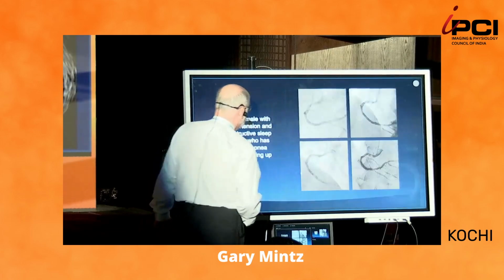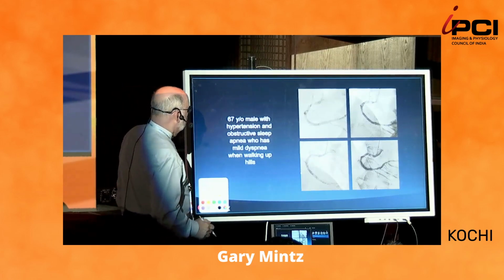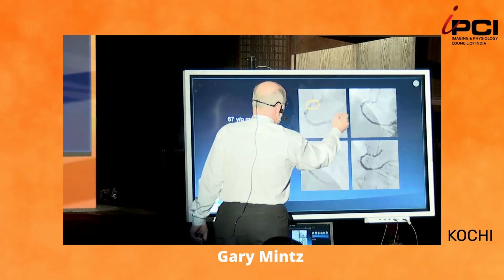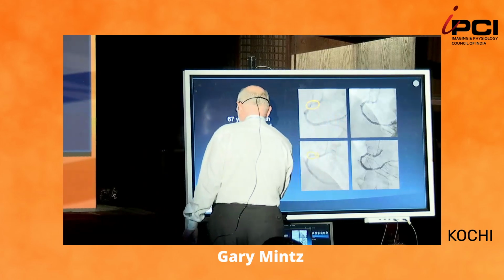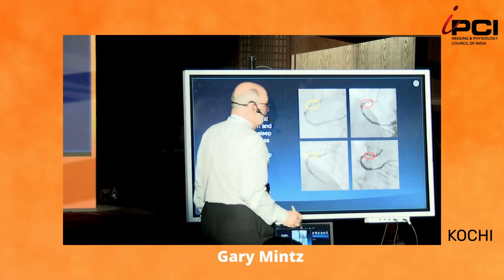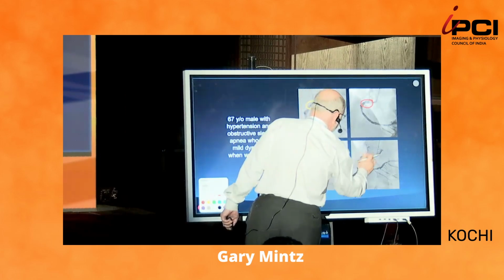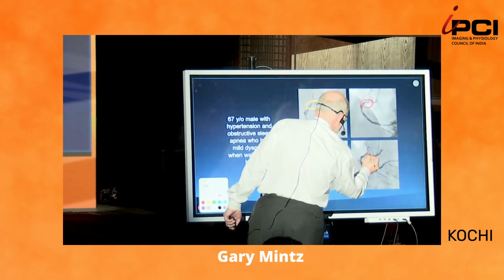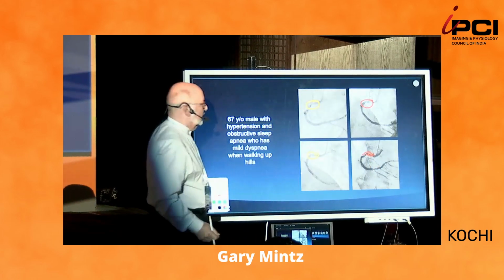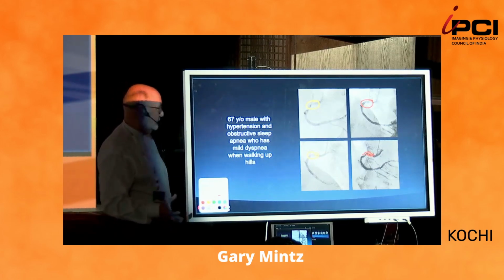Now, this next case is sort of interesting. We have angiograms at 2 time points looking at the proximal right, here, and then here. And you can see clear evidence of a rupture angiographically. It's this. Let me see if I can draw it out. Call it an ulcer, whatever. Ulcerated plaques are plaque ruptures. It's a cute angiographic term that means plaque rupture.